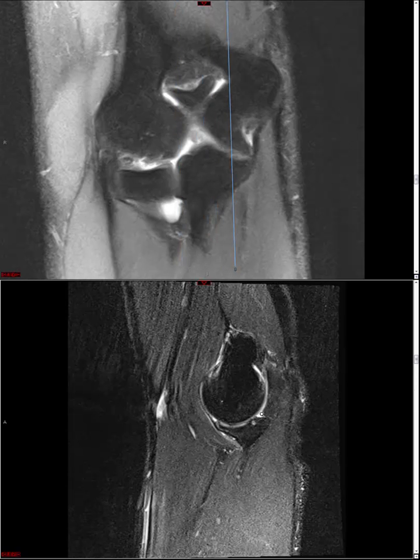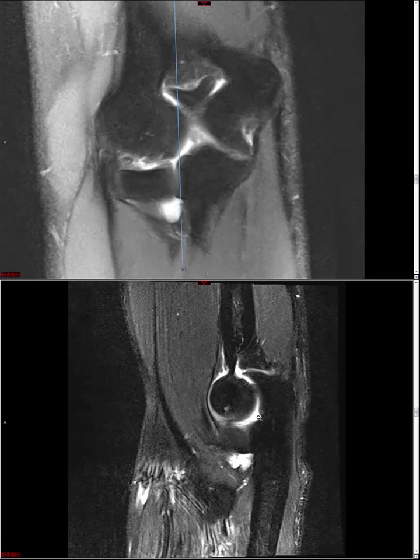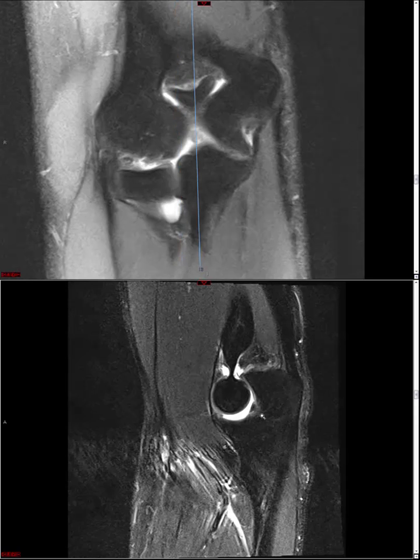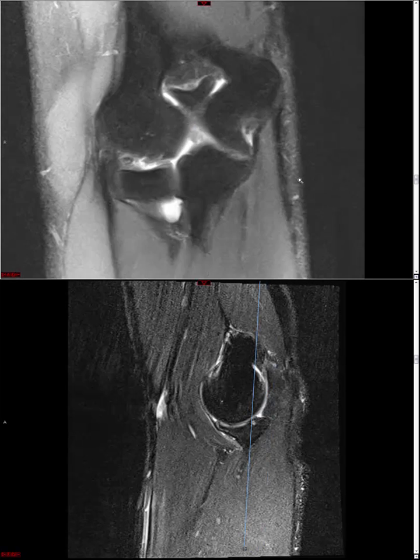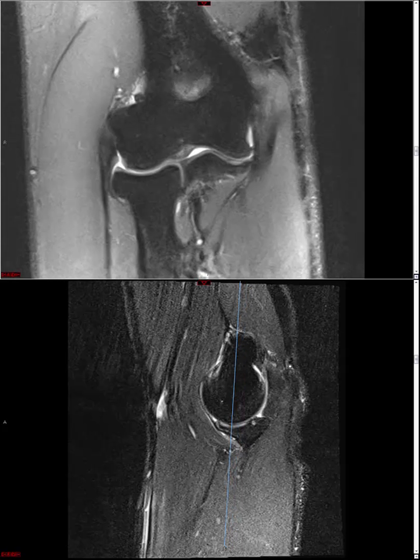Okay, so there's again the medial side, there is the divot on the radial side or lateral side, and these are not to be misconstrued as pathology either. So having gotten the normal variants out of the way, now we can actually assess the cartilage.